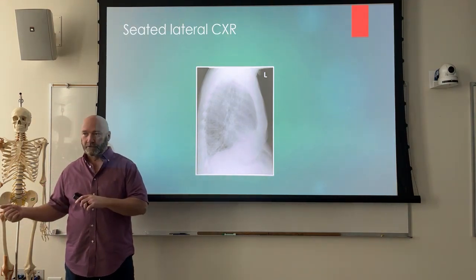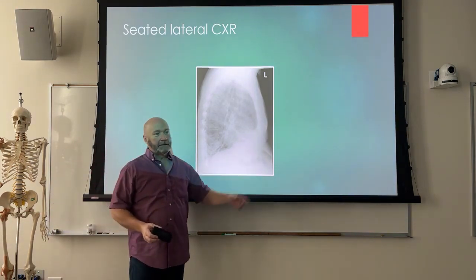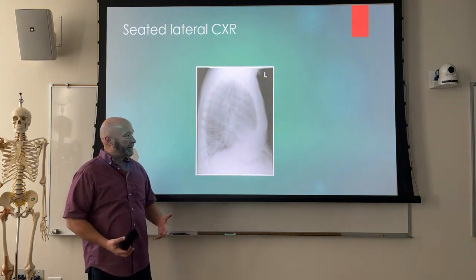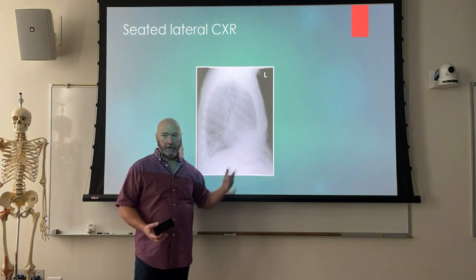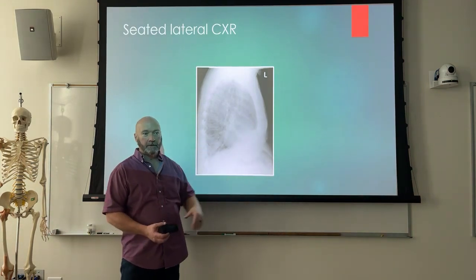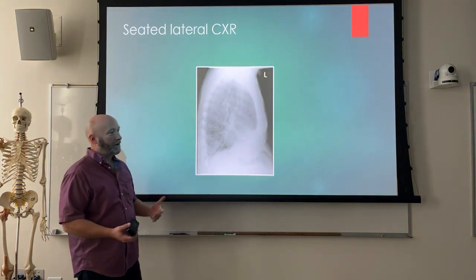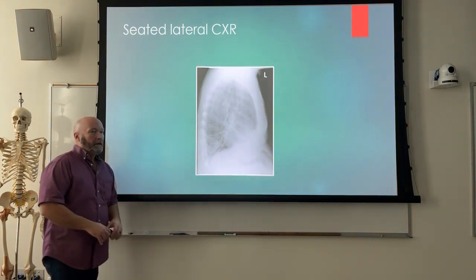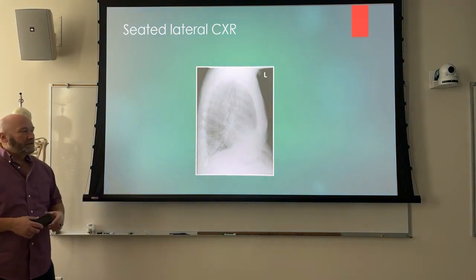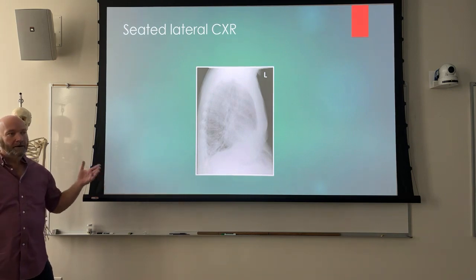So you take the patient on the stretcher and you pull the patient up to a 90-degree angle, and what happens is that the contents of the abdomen are going to push into that inferior portion of the anterior lung field. It's going to deflate it. Okay, superimpose, deflate, and you're going to have this appearance. It kind of looks like you've got a pleural effusion that's affecting the anterior portion of the lung field. Okay, so if you're doing a lateral chest X-ray on a patient on a stretcher, you've got those great big image receptors now, right? Hopefully you've got one of those 17 by 17s in the wall bucky.